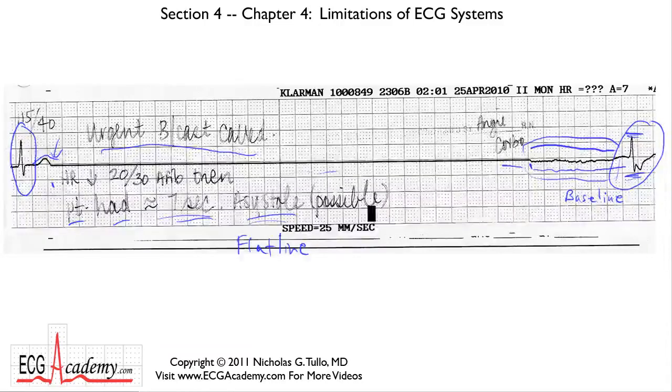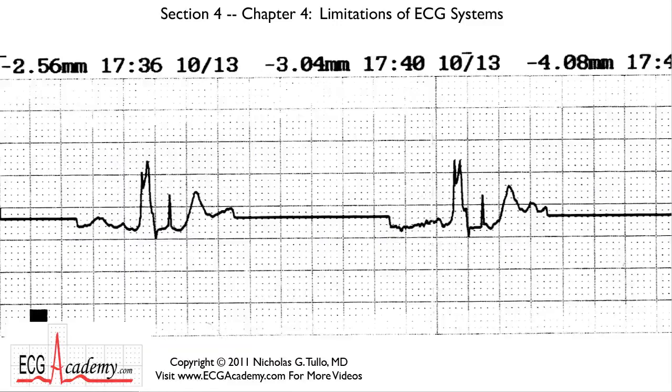Now I'll show you another example of that. Now this was a patient who was on the monitor, and they were.